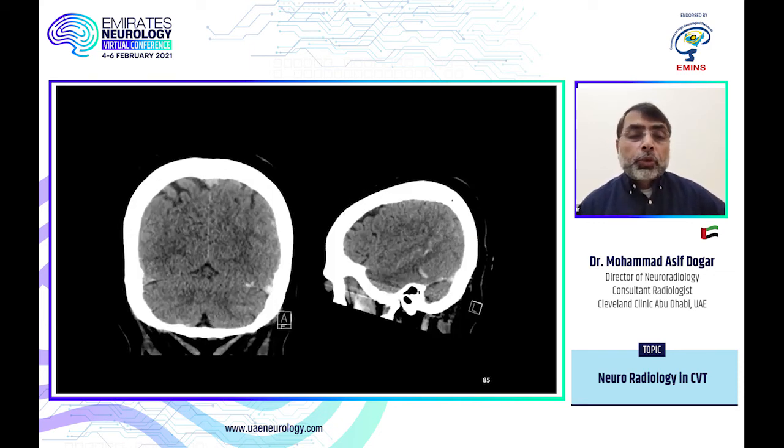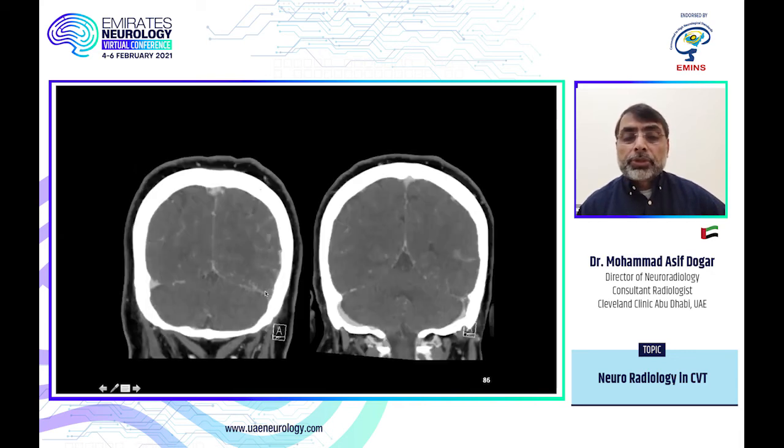So this is our friendly coronal image. Compare it here. So here is even the parenchymal hemorrhage. This vein is hyperdense as compared to the superior sagittal sinus, as compared to the right transverse sinus. So the left transverse sinus is hyperdense. We can even see it on the parasagittal image. Now you do the CTV, and you can clearly see there's a filling defect in this transverse sinus.